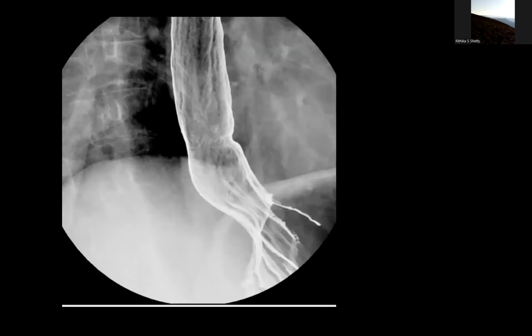Coming to spotters. So whenever we see fine reticular pattern, then the most common diagnosis is Barrett's esophagus because of columnar metaplasia.